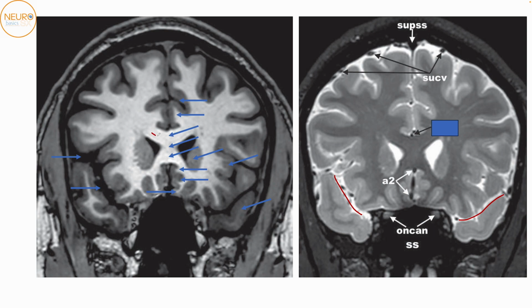You have the corpus callosum. This is the body of the corpus callosum now forming the roof of both lateral ventricles over here. On the side of both lateral ventricles, we know there are two C-shaped structures forming grey matter. This is the caudate nuclei on both sides. They form the floor and the lateral wall of the lateral ventricle. Okay, so this here is the genu. This is the body, and this is the rostrum, the part which goes down around the frontal horn.